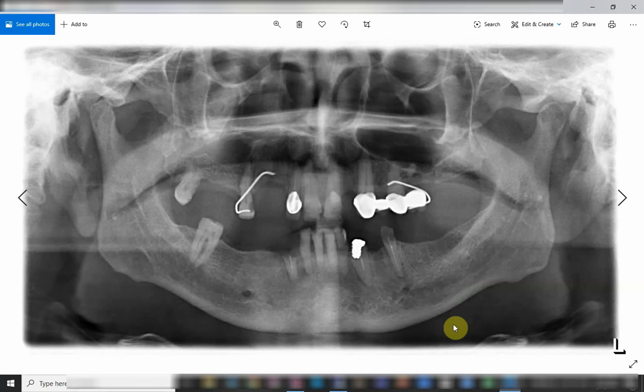I think it is better, before we go to the periapical radiographs, to have a look at the course of the inferior dental canal from its start to the exit, and the best view that would show us this is the OPG, because it covers the whole mandible from right to left.